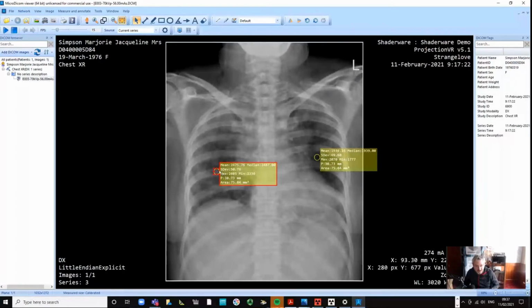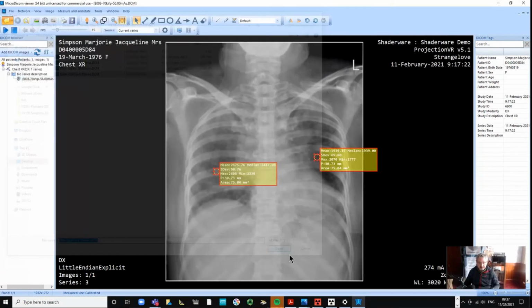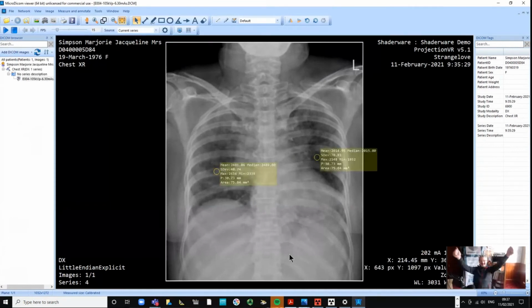Okay, so what I'm going to do, I'm hopeful, but not necessarily entirely. Let me pick both of these. Yes, Control C. I'm very hopeful that when I open the next image, I'll be able to paste them onto it in exactly the same location. No, I've done that before. That's brilliant. So, okay, so reading off.